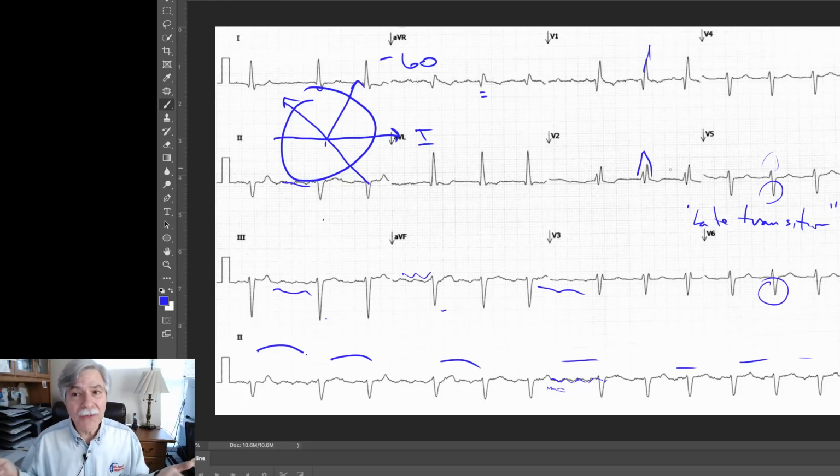So when you have atrial flutter, now it's a whole different ball game. First of all, Eliquis was perfectly fine to use because atrial flutter does increase the risk of stroke just like atrial fibrillation does. But atrial flutter comes in a bunch of different varieties, and there's a typical atrial flutter, which this looks like. It has that gradual downsloping flutter wave that quickly resolves, and you get this sawtooth pattern that's very easy to recognize in the inferior leads.